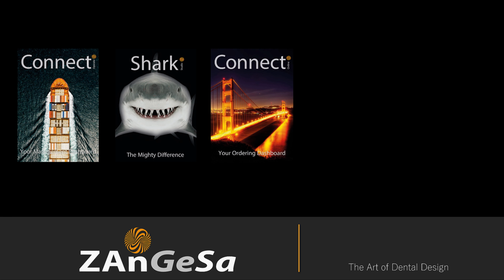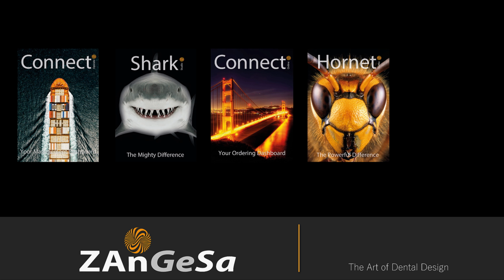With Connect Online you can directly order cases from your preferred milling center over the web. Or if you want to print your cases with your own printer you can use Hornet Studio, which is a 3D printing slicer software for all industries, with advanced support management and real-time operations.